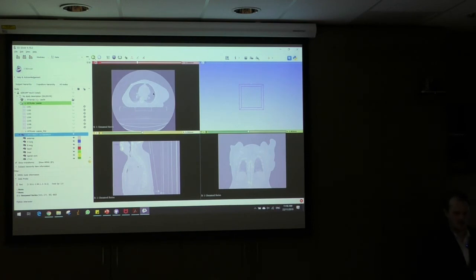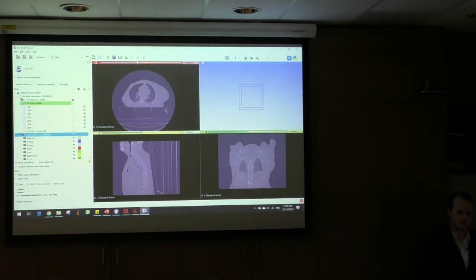When we are with our scans, we can change the window and level of those scans as well. We can do that by holding a mouse button and dragging left to right to change the brightness, and up and down changes that viewing option. It's similar to how ImageJ works, if anybody's worked with that program.